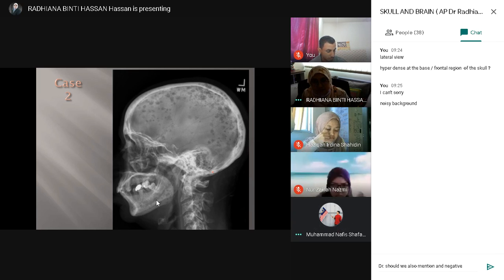Okay. Then my diagnosis will be multiple myeloma at this point. And your diagnosis is multiple myeloma. So your differential? Differentials, maybe I think metastasis, and then maybe osteoporosis. Better.